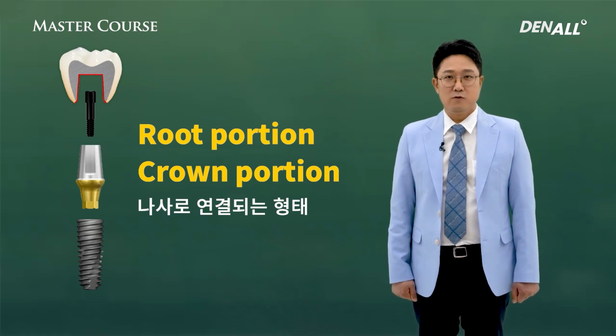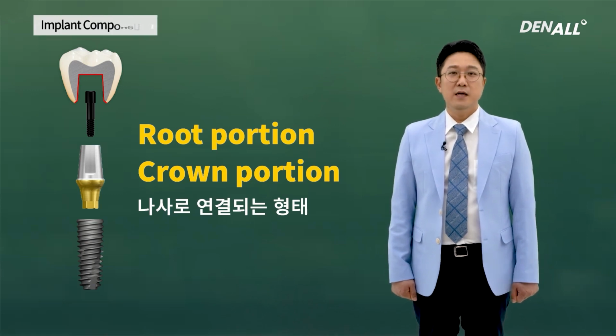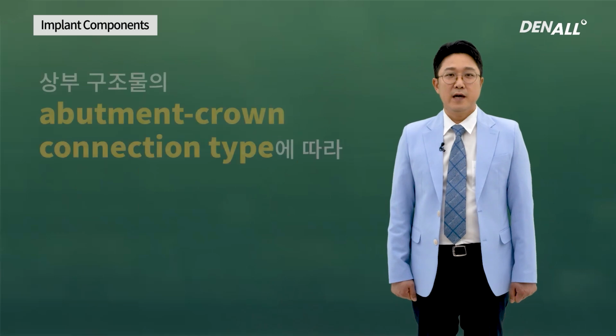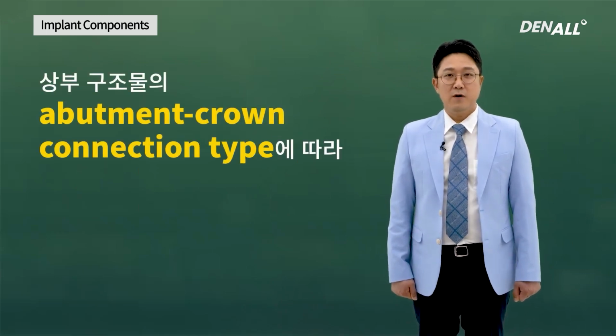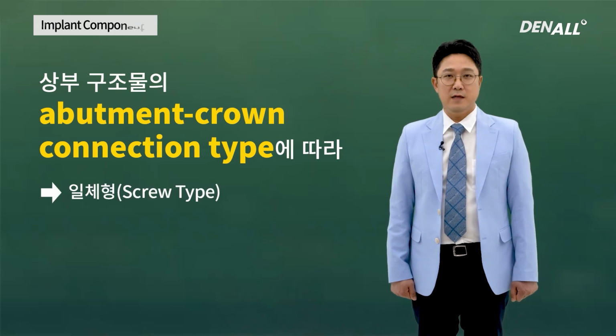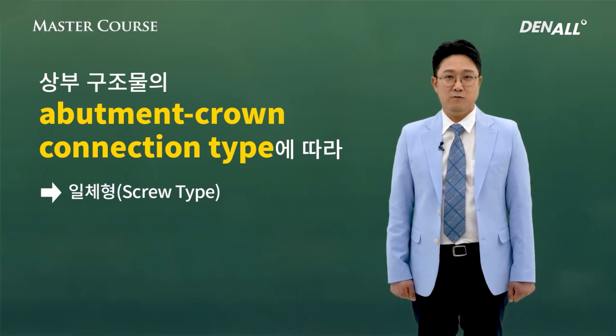Among these, the superstructure, in other words, depending on how the abutment and crown are connected, can be divided into 3 different options. First is the one-piece screw type where the abutment and crown are fabricated as one.